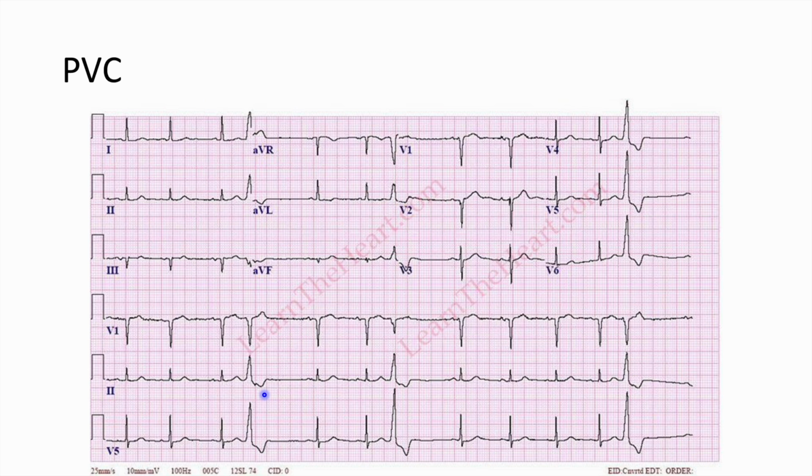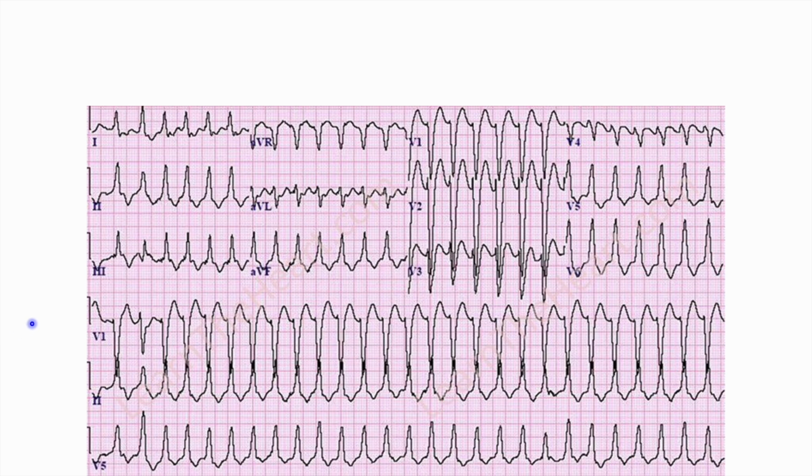Some EKG stuff is going to just be pattern recognition, but some of it you should be able to understand and explain. We have a strong ventricular contraction here, but it's premature because normally we should have this long distance, but right after our T wave here, we have boom, ventricular spike, and then we need to repolarize and recuperate until we get back into sinus rhythm. So with PVCs, you want to look for this boom, big spike. Take a look at this one.